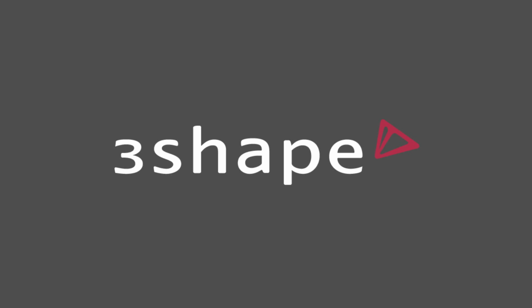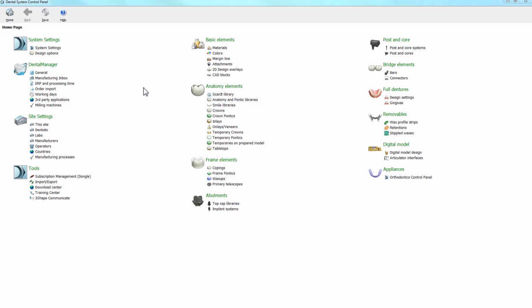In this video we will show you how to set up a manufacturing process in the control panel. If you are a milling center or manufacturer, you have the possibility to create your own manufacturing process in control panel. Setting up a manufacturing process allows you to connect specific materials to specific manufacturing processes. It also gives you the possibility to select the required DLL to generate the correct CAM output.